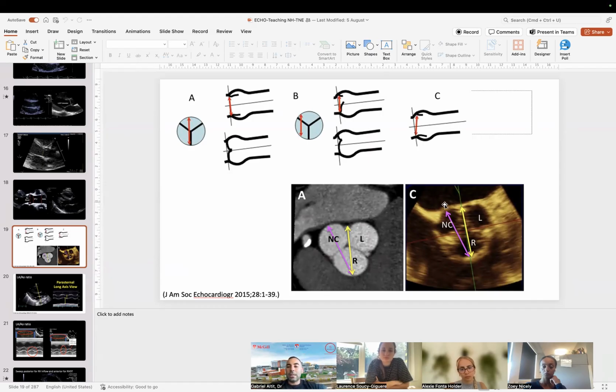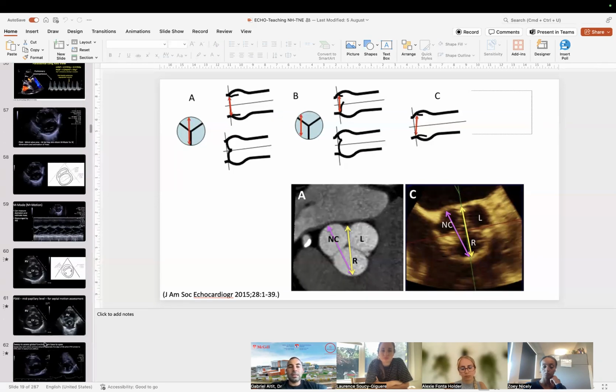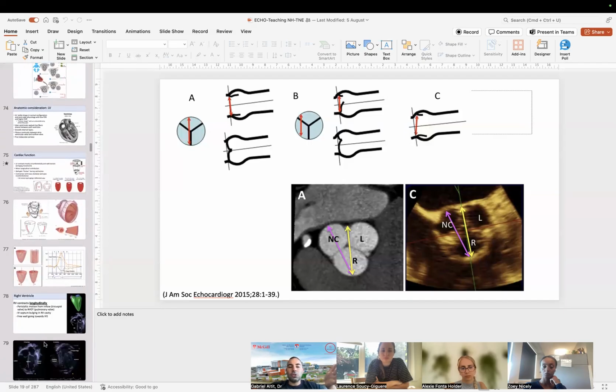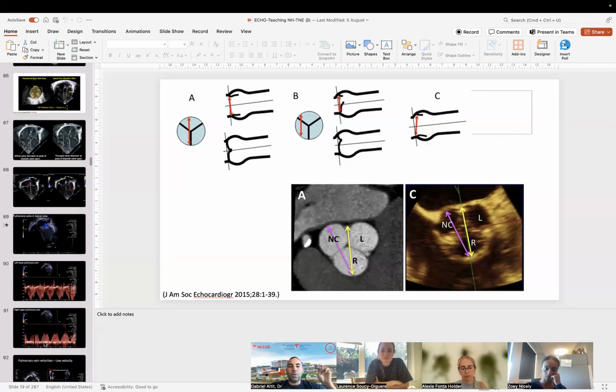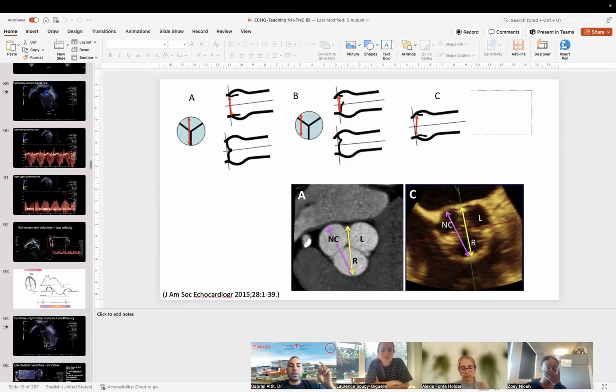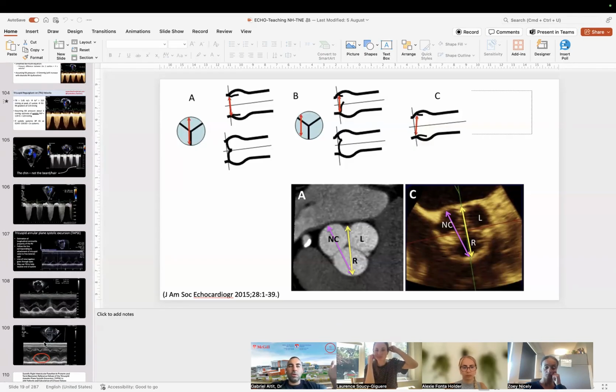So we assume that it's a perfect circle, but it's not a perfect circle, right? So these are assumptions that bring variability and mistakes in the real calculation. And so you'll see sometimes numbers that, quote unquote, don't make sense because you have no shunts anywhere and you get an RVO of like 400 and an LVO of 250.